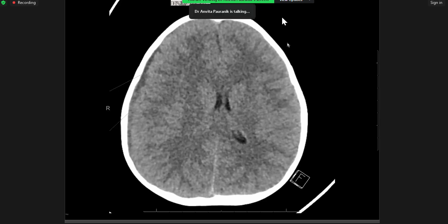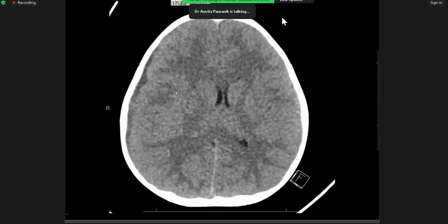Now that Dr. Chirag has mentioned Haemophilus influenzae, that I will probably not put in my report. That is not our job. Yes, there are certain patterns which are described, and certain bacteria are more common than others. But anyways, yes, can we check the middle ear? Definitely. We will have to follow our checklist on our CT scan. So we are not done yet.